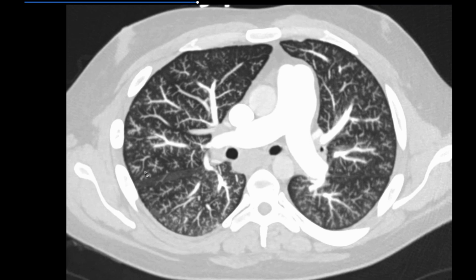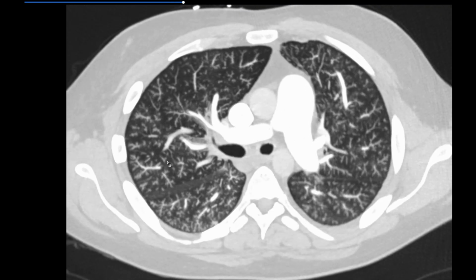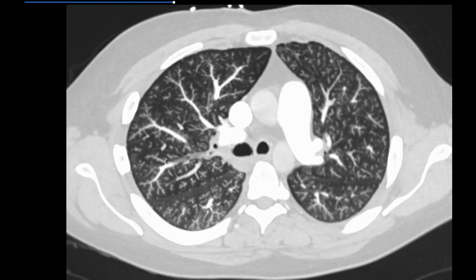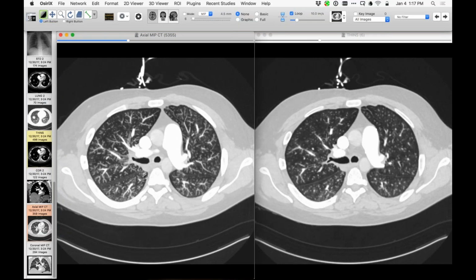So he does have a history of drug abuse, and I think making this observation about what these vessels are, it's really a slam dunk. There's no differential diagnosis for this. So we've shown this one before, but this is a really nice example of it. David, I think you've seen that one. Yeah, I love it. It's beauteous.